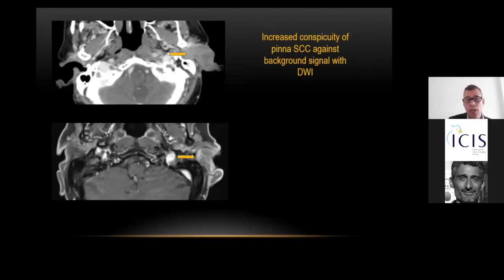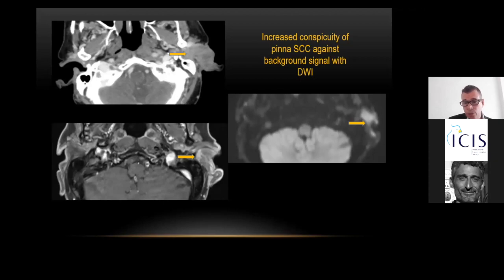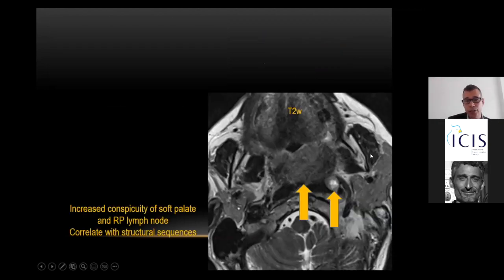Well, first of all, when we see squamous cell carcinomas, they often merge with the adjacent soft tissues, with the adjacent edema, and potential treatment effects. And diffusion-weighted imaging is successful in terms of removing those effects and better depicting the extent of cellular tumor.